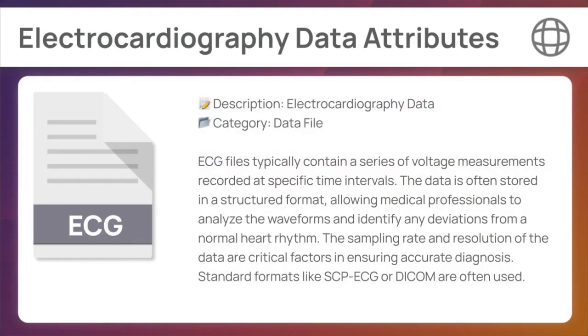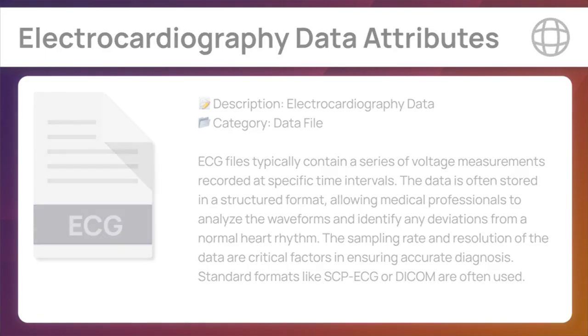The data is often stored in a structured format, allowing medical professionals to analyze the waveforms and identify any deviations from a normal heart rhythm. The sampling rate and resolution of the data are critical factors in ensuring accurate diagnosis. Standard formats like SCP-ECG or DICOM are often used.